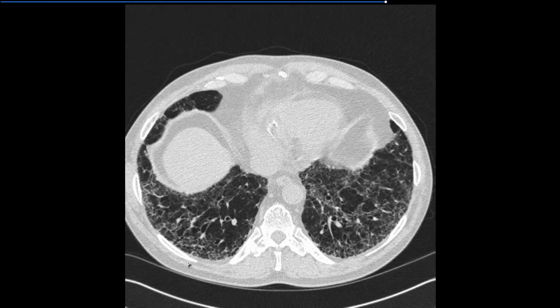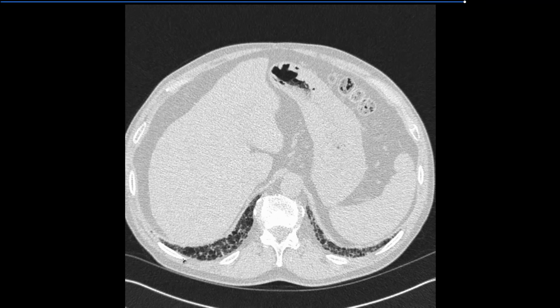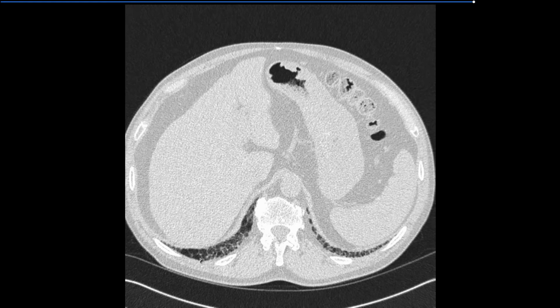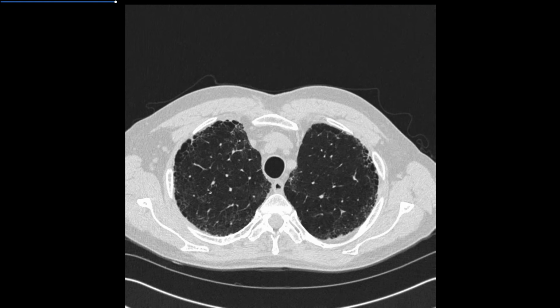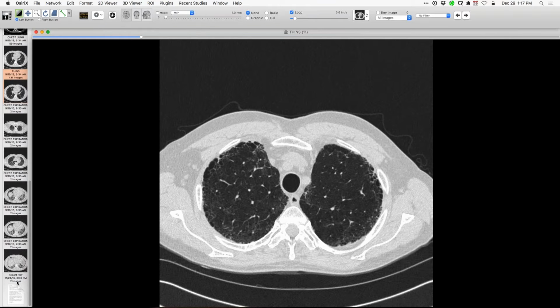So certainly with respect to the lung bases, in the form of subpleural bronchiolectasis and honeycombing, it's relatively unimpressive, and the involvement of the upper lung zones is rather impressive, at least with respect to subpleural bronchiolectasis and honeycombing. So not typical for UIP.